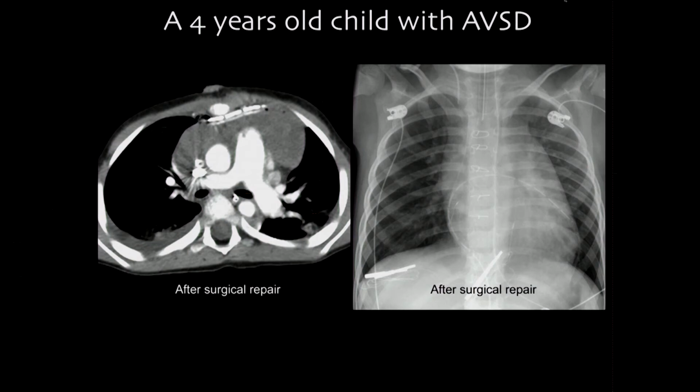However, actually a normal thymus can have very, very rapid ballooning. If the patient's condition prior to surgery was cyanotic or very critical, and after successful surgery, even within the ICU, I have seen cases with ballooning of the thymus as a normal rebound growth. But however, you should always think about the surgical complication.